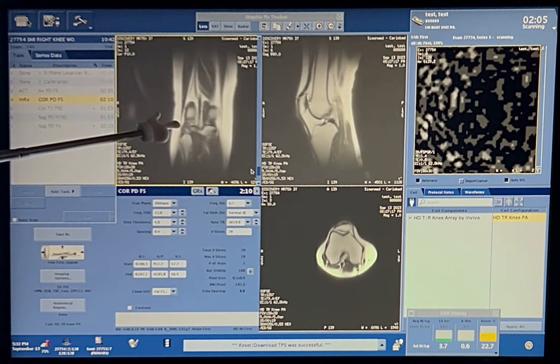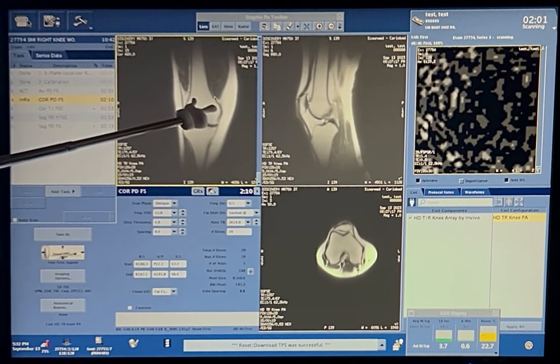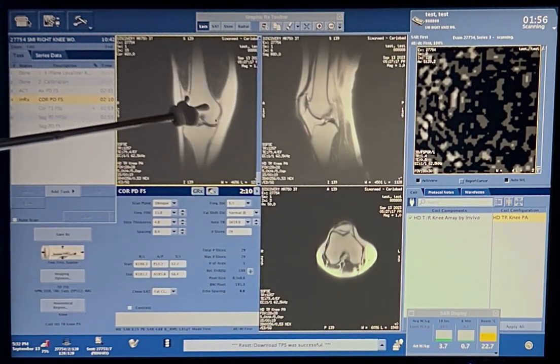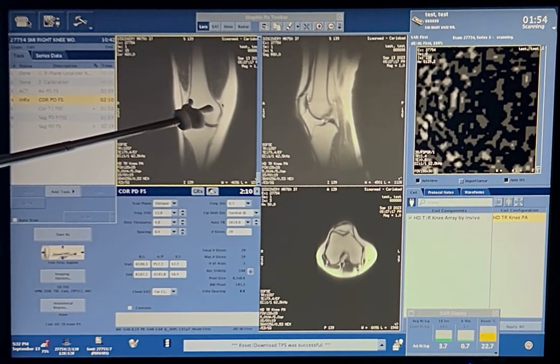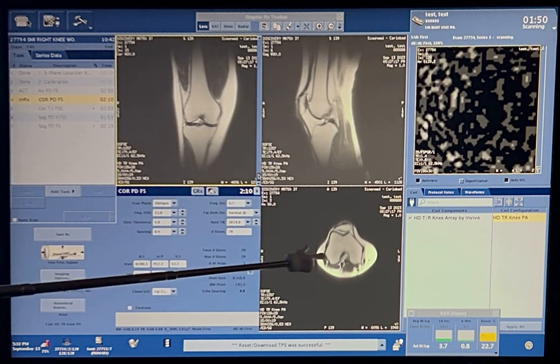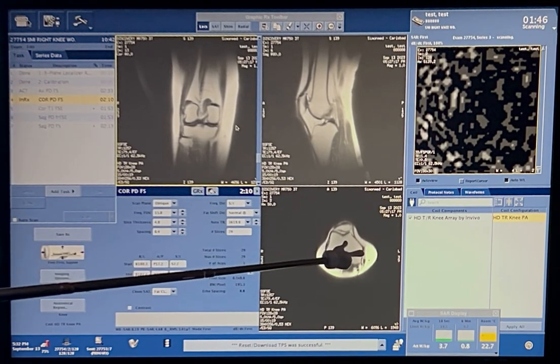Other way. Lateral and medial epicondyles. So that's what we're seeing here and here. It's like this elevated region. I don't really know how to describe it. And then when you scroll up, you'll see that you only get these. See, now that and this are the condyles right here.